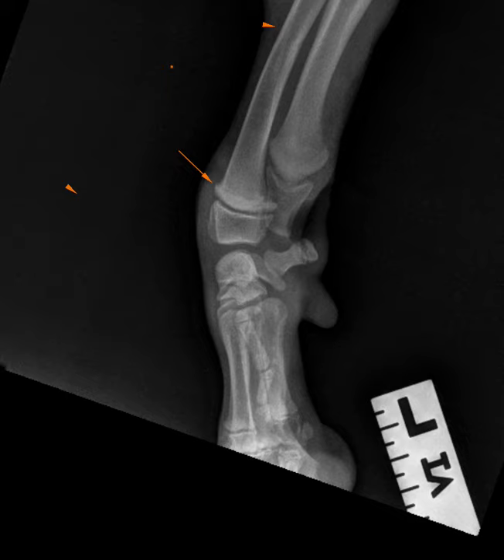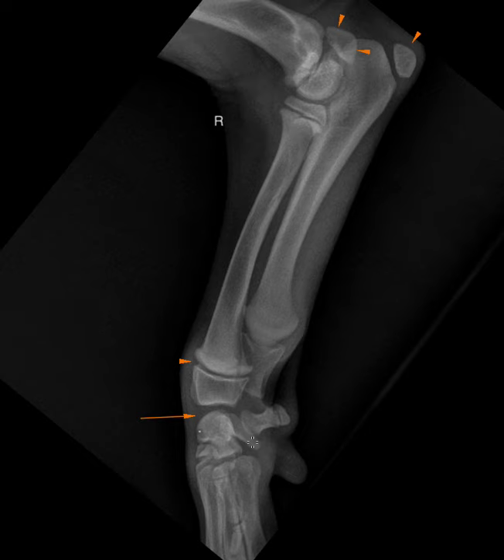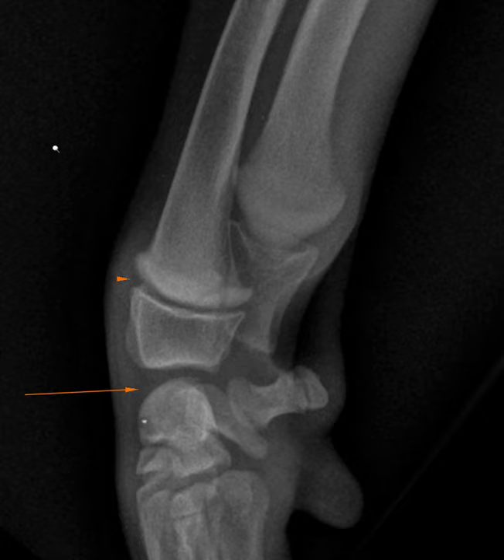I'm going to show you the other limb so that you can see that it's quite bilateral. This little whiff of metaphyseal flaring, and I'll just get this arrow out of the way, this little whiff of metaphyseal flaring here, and actually on the caudal aspect it's even more prominent. This is probably the only thing I would comment about in this case. Now, whether that's a normal anatomic feature for this dog, I think it very likely is.